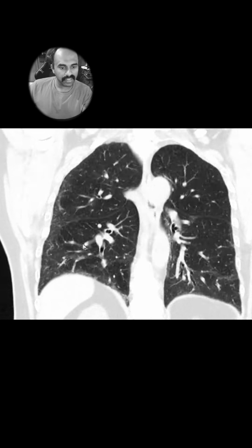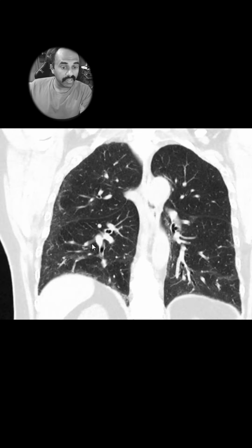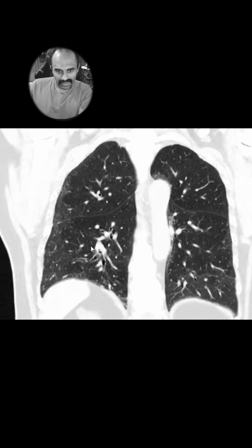So you can see that all the corresponding areas of lack of aeration appear as interlobular septal thickening, ground glassing in the periphery, subpleural margins. This is the typical apicobasal gradient that is seen in the usual interstitial pneumonia pattern of interstitial lung disease. Okay, so try to use volume studies to understand more of lung pathology.